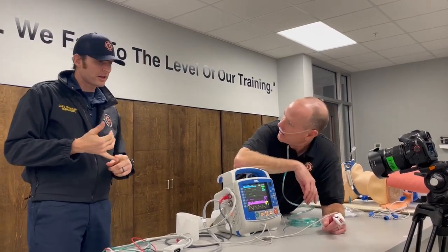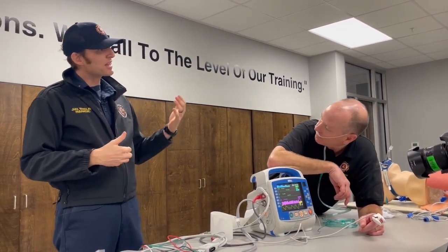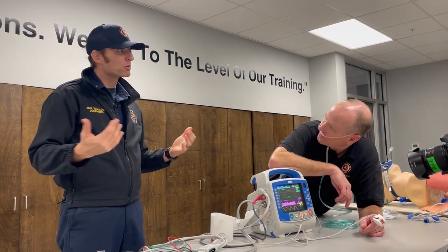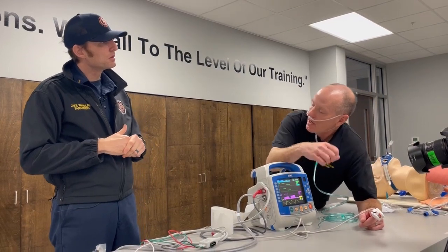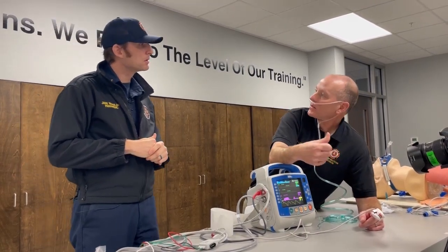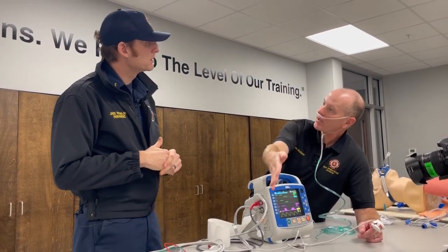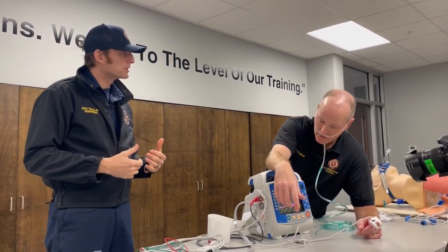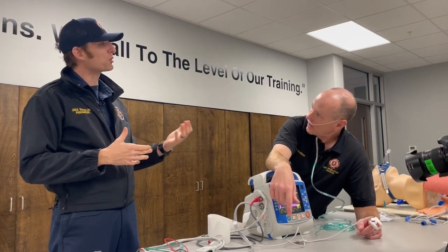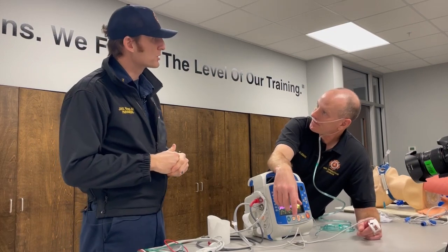So we talked about cardiac arrest, and we're going to segue right into airway management, right? Is end tidal, capnography, important with airway management? Oh, it totally is, because this can actually tell you, if I happen to be intubating, yes, my tube is good. I've actually got a complete circuit, and I'm actually able to ventilate. So if you have an appropriately placed endotracheal tube, you should get some sort of end tidal reading on that. I will have a waveform and at least an end tidal greater than 10. Okay, and that's very important, right?